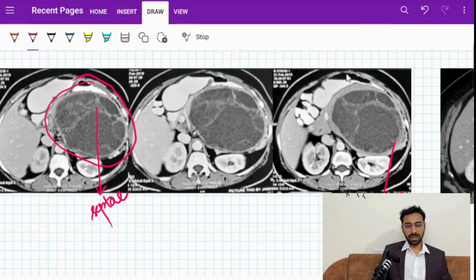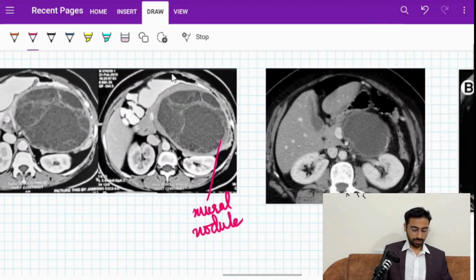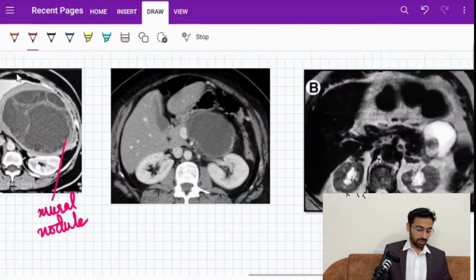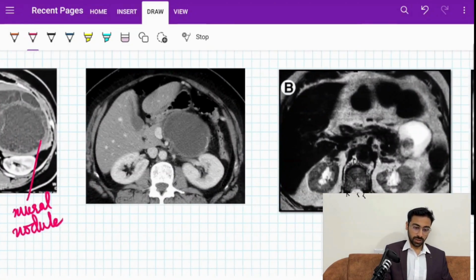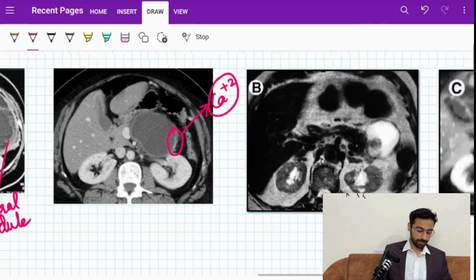This is a classical mucinous cystic neoplasm. Here you can see a unilocular variant of mucinous cystic neoplasm. Here there is peripheral calcification that fortified our diagnosis and helped us differentiate from a pseudocyst. This patient also had chronic pancreatitis. So this calcification was quite important.